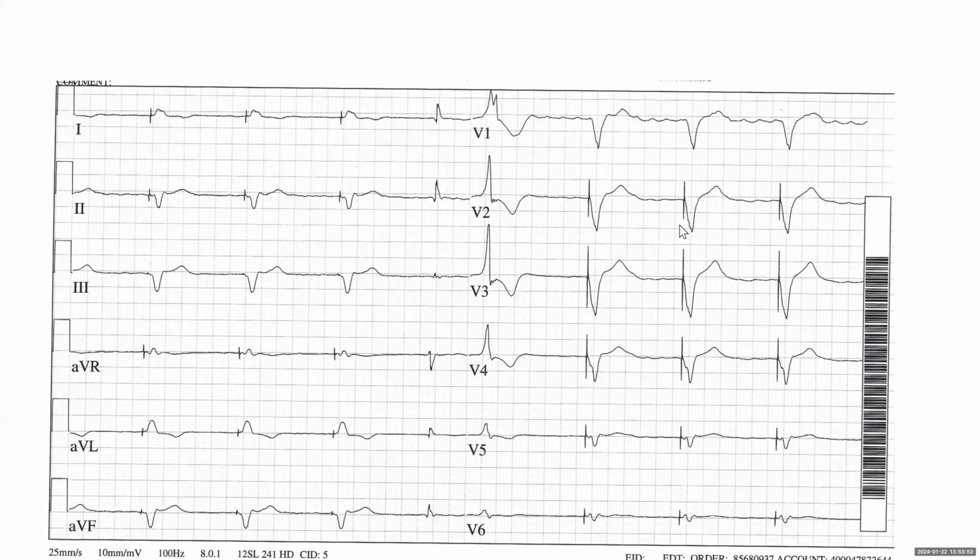I'm not going to go into it now, but for the exam, really don't overthink it. Then there was a comment about repeating the codes. Yeah. So atrial fibrillation with slow ventricular response, paced ventricle, single PVC, left axis deviation, and non-specific STT changes.